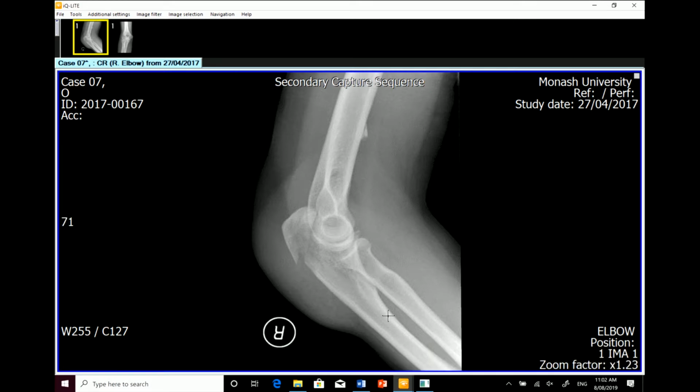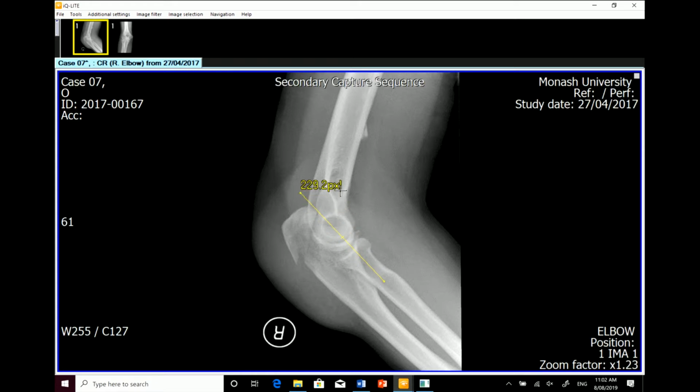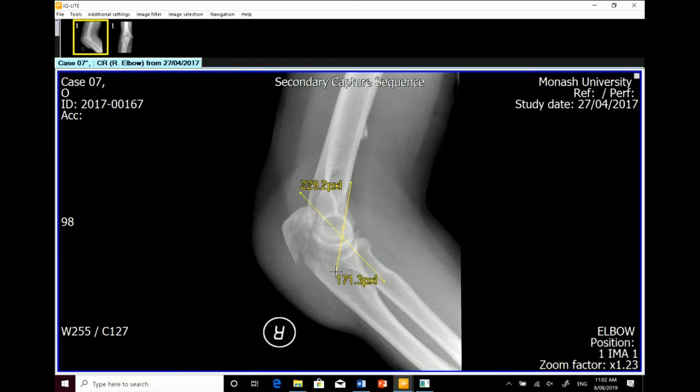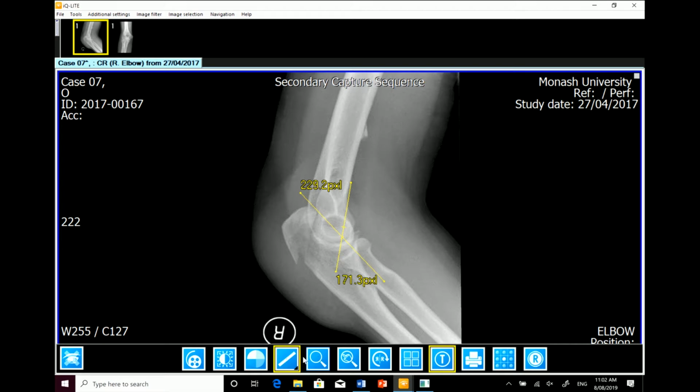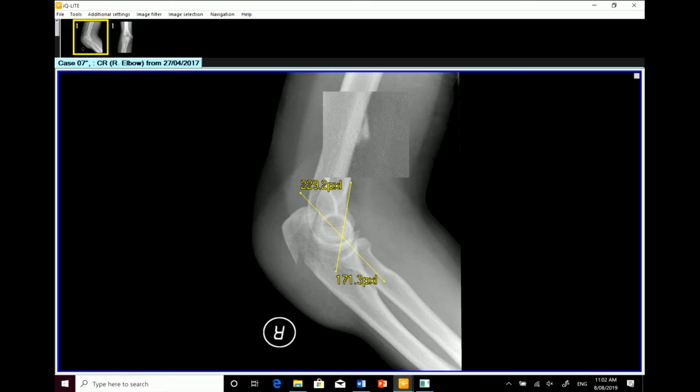but it's quite important when you have fractures close to the elbow joint to check whether the alignment is normal. And if we draw the radiocapitellar line, that's normal. And if we draw the anterior humeral line, they all bisect the capitellum. Importantly, though, there is a normal variant, which we can see on the anterior humeral part, and that is called a supracondylar spur.